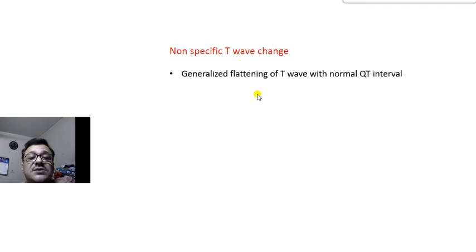Non-specific T wave change. What is seen with the non-specific T wave change? General flattening of the T wave with normal QT interval.